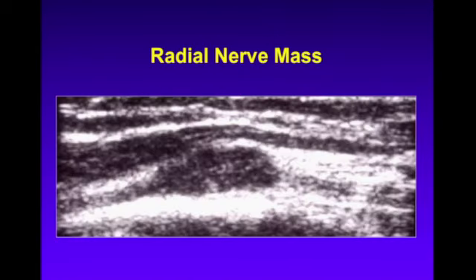This case taught me early on in my career how important nerve imaging was in this patient who had a complete wrist drop. But we had a frustrated neurosurgeon on our hands because they did an MRI and the MRI was equivocal and they couldn't really tell him where the lesion was. You can tell the image quality is not as good as with some modern equipment because this was many years ago. But what I did was basically traced the radial nerve, and lo and behold, there was a mass involving the radial nerve. This was about midway in the arm.